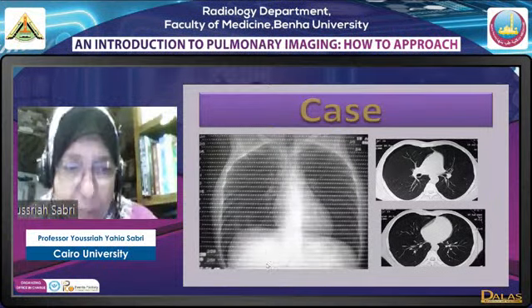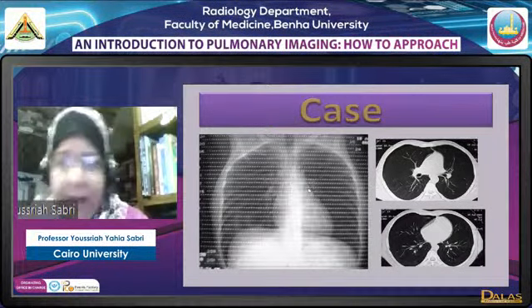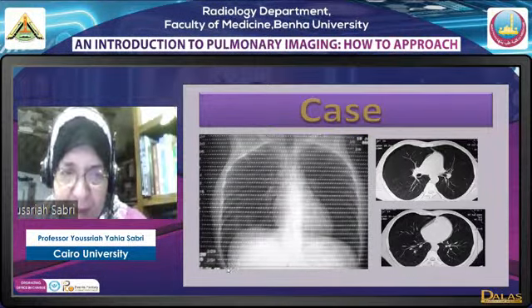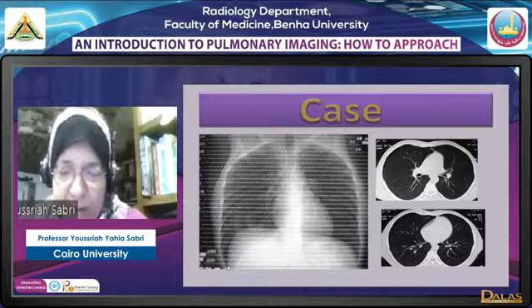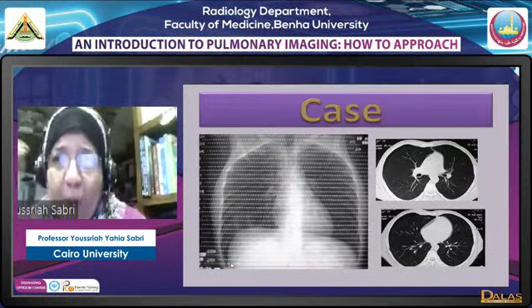Now here, what do we have? This is a scanogram in a case of pneumothorax. Look here, this is a normal costophrenic angle, while this is a deep costophrenic angle, a sign that we call deep sulcus sign. This is how we see pneumothorax in a supine patient.